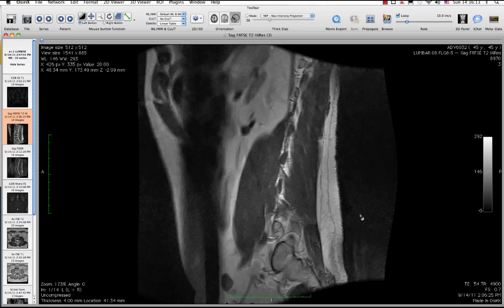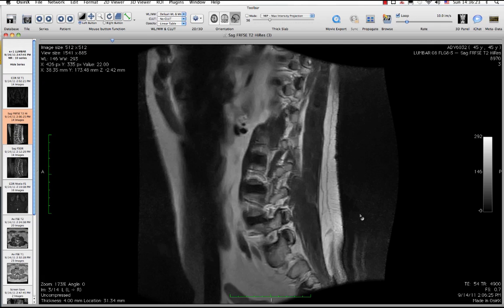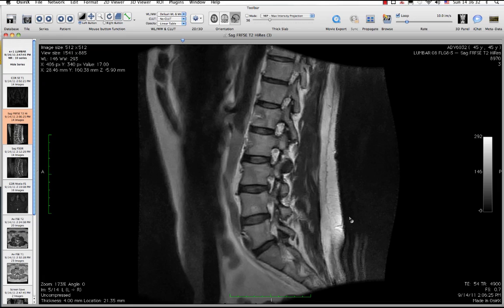Okay, here we go. So here we can see a little hip joint, some muscle, but we're not really seeing the spine yet. Then the next slice, we're getting a little bit more. Now we start to see a little more. Here's the spine starting to take shape. And then one more, we're going to get a pretty good slice of the spine.